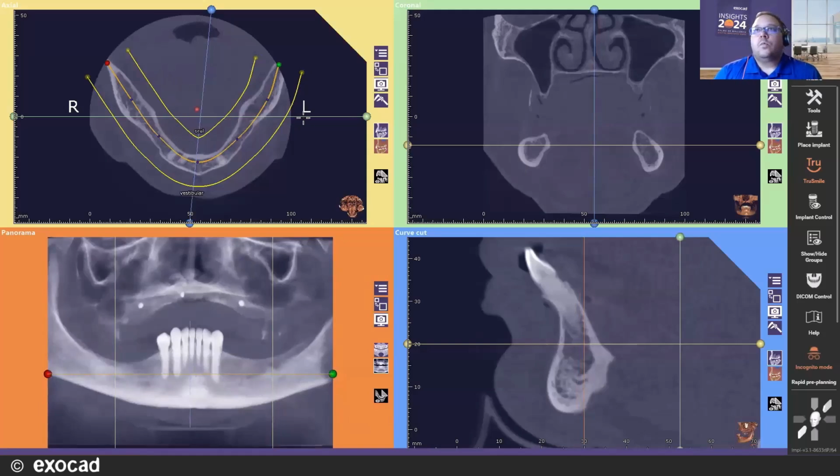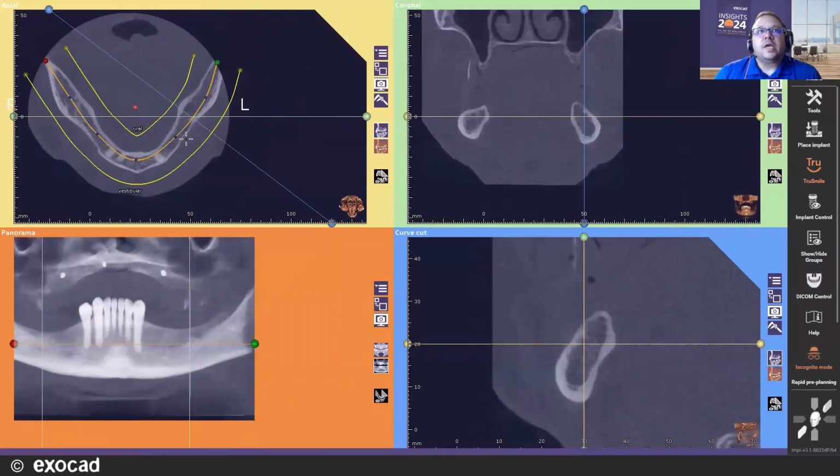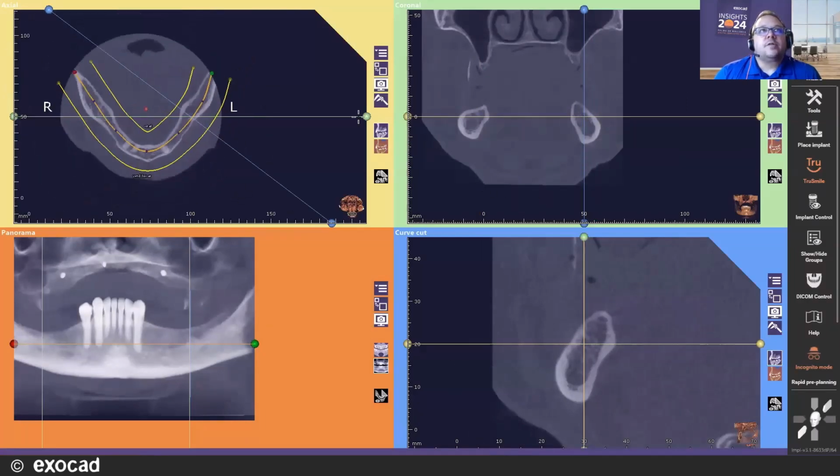One thing to point out as well within any of these views, if you click in your mouse wheel button, it'll center those views based on that position. So now you can see we're looking in the same area in those different view sets.